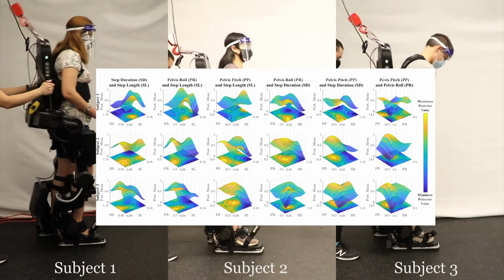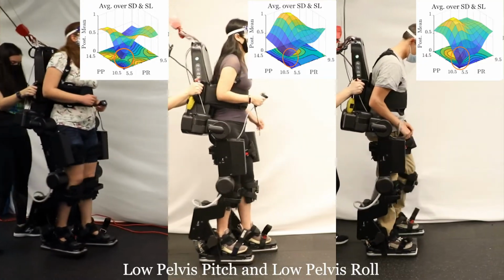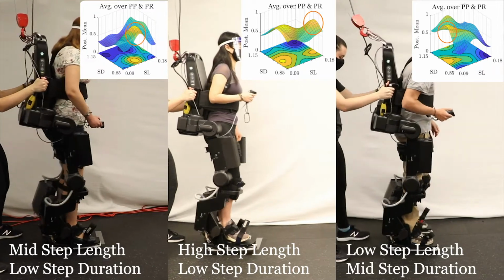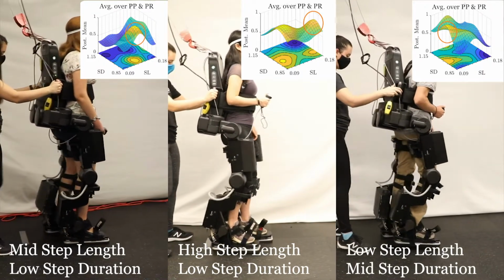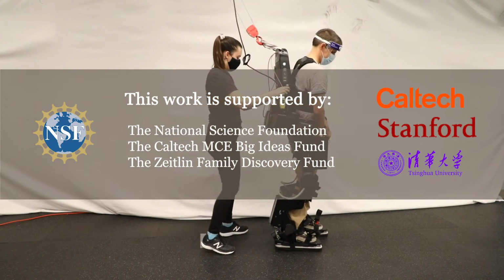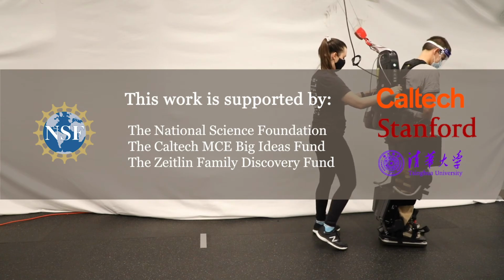These learned landscapes highlight both regions of agreement and disagreement among the subjects. For example, all subjects strongly dislike gaits at the lower bound of pelvis pitch and pelvis roll. However, the subjects disagree in the most preferred gait region of their utility landscapes across step length and step duration. This work presents progress toward better understanding the mechanism behind user-preferred walking and optimizing future exoskeleton gait generation for user comfort.